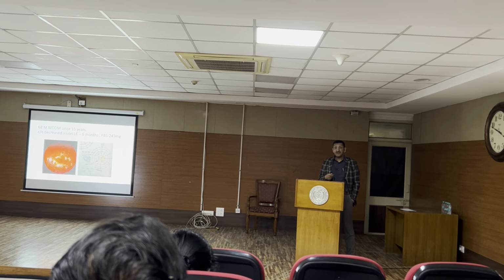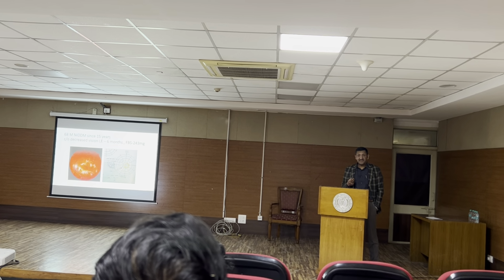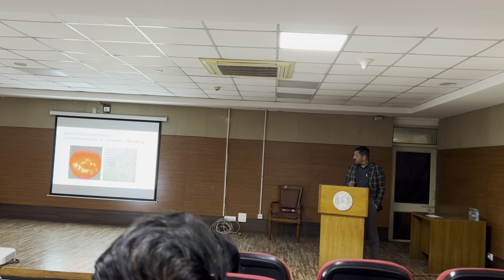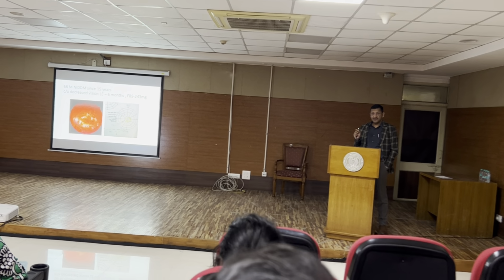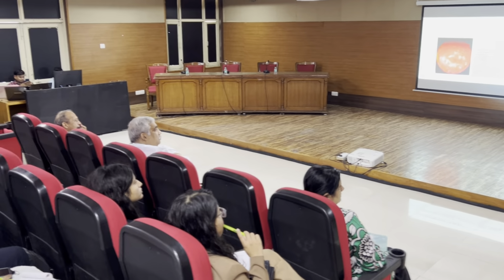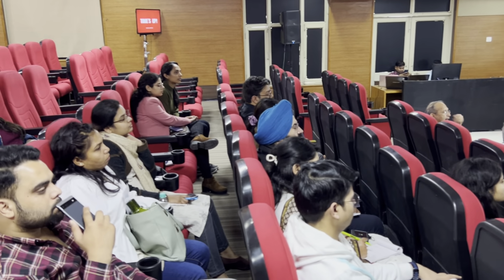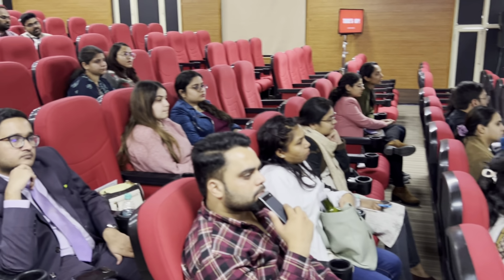The next question he is going to throw at you is, okay, what are the findings which are suggestive of diabetic retinopathy? Your answer would be, see here, there are hard exudates, microaneurysms, superficial hemorrhages, cotton wool spots, neovascularization, and the patient is a diabetic. So all these findings are suggestive that this is a patient of proliferative diabetic retinopathy with macular edema.